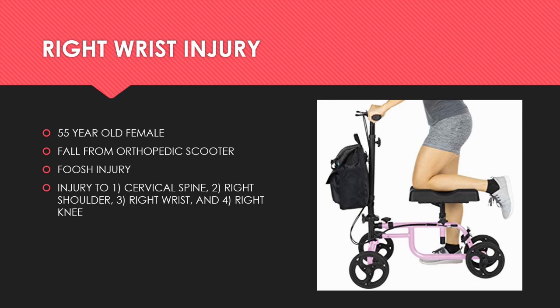Now, the AMA guides don't provide us diagrams so that we can visualize the assessment of the scapholunate gap, the lunotriquetral articulation, or for the assessment of ulnar translation, but I'll show you how we make those assessments on the radiographs in just a few minutes.